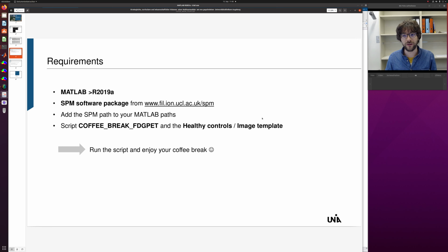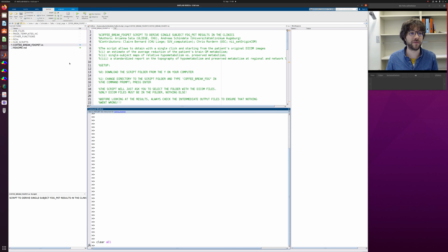If you have all this, you can run the script and enjoy your coffee break while the script is doing all the work. Now I want to show you how to run the script, what is important to look at, and the outputs of the script. First, as I already said, we need to include the path.